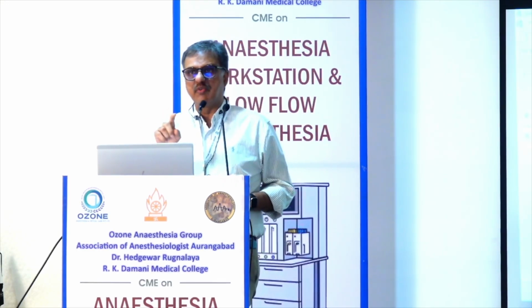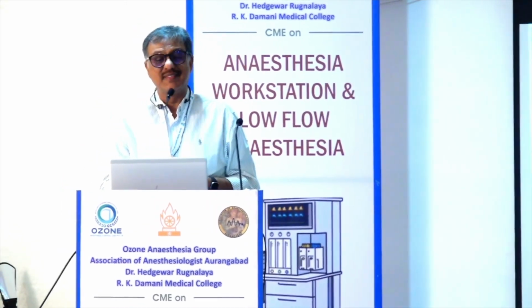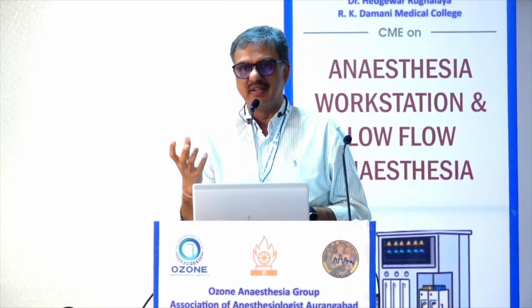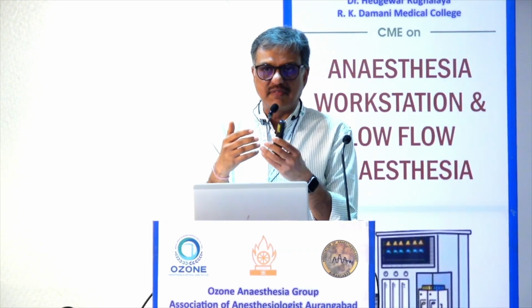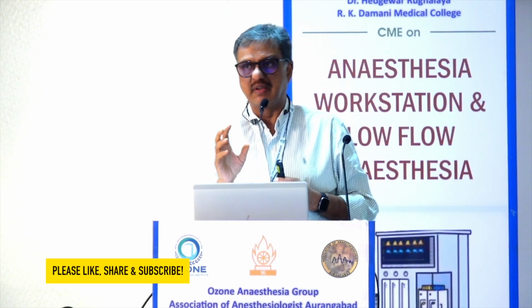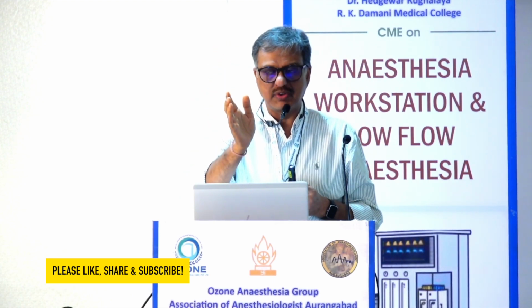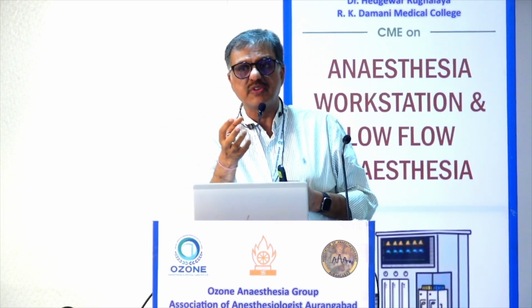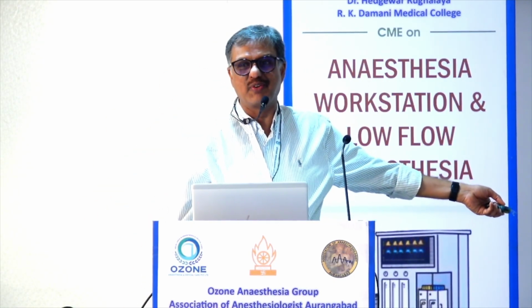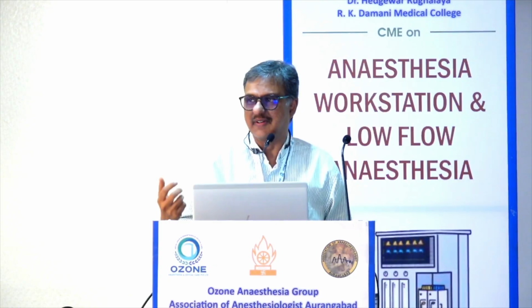Again, this simulation was done with 100% oxygen. I am giving the clue. Exactly. See, what happens is called the concentration effect. When we anesthetize the patient and start induction with 100% oxygen, apart from minute ventilation minus dead space ventilation, because of the partial pressure gradient generated between alveolar oxygen and blood oxygen, passive diffusion of oxygen happens from alveoli to blood. That is also shown by this software: how much oxygen is additionally diffused into the blood vessel.